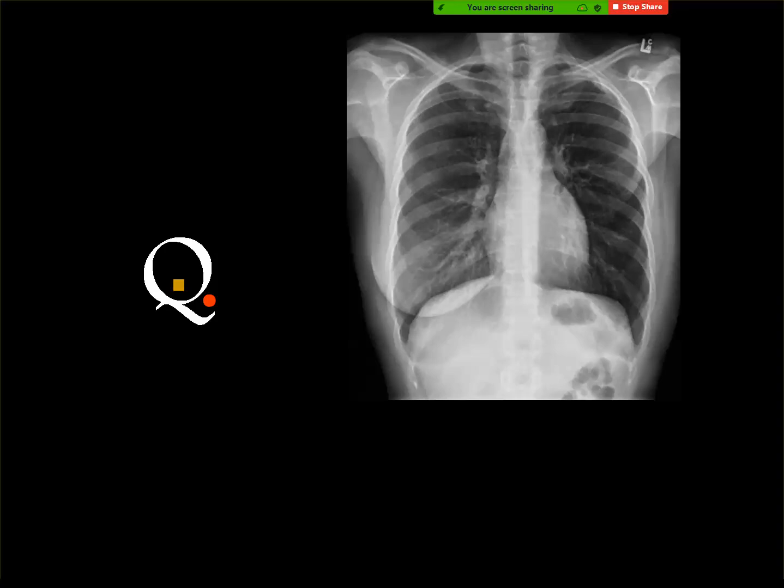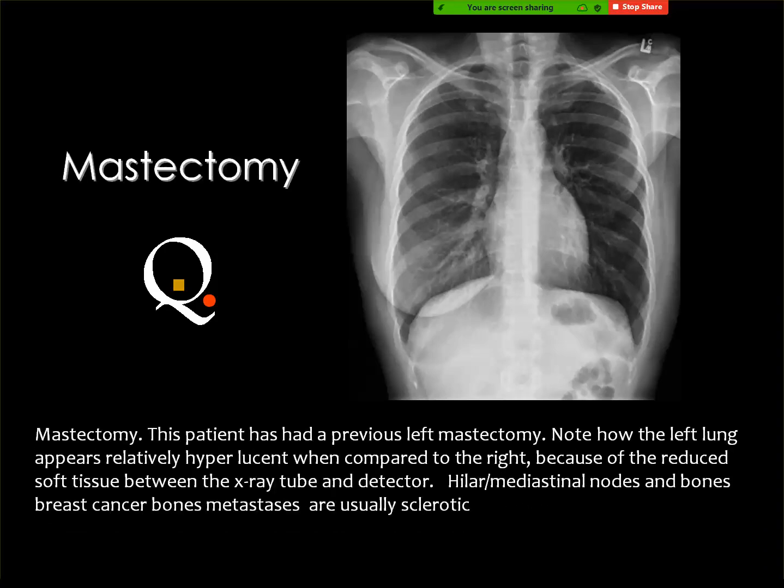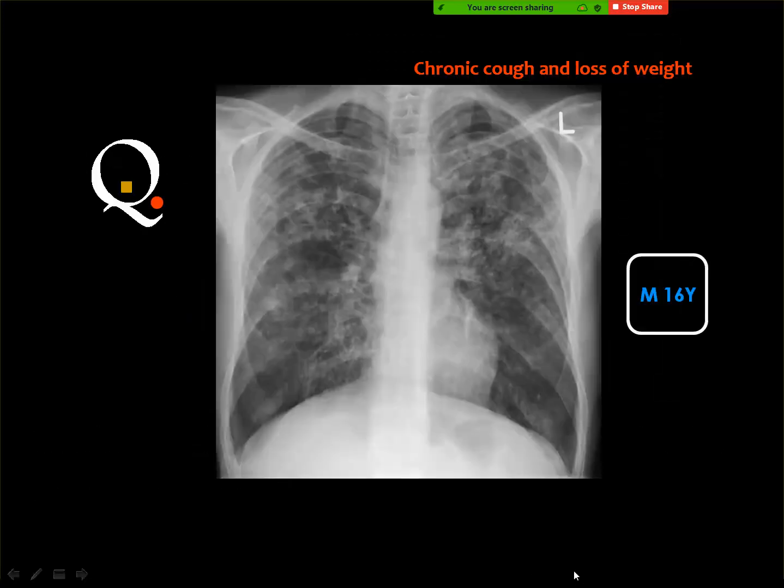There is no breast shadow on the left side. I give you a note just a few seconds before. If you are interpreting a chest of a female, be careful about the breast shadow, especially in the exam. This is one of the famous tricks in the exam.